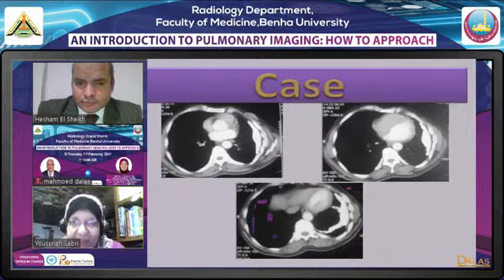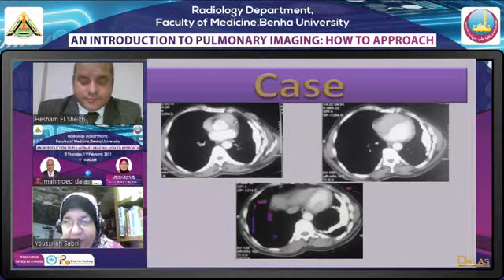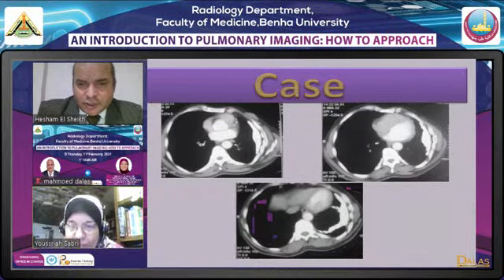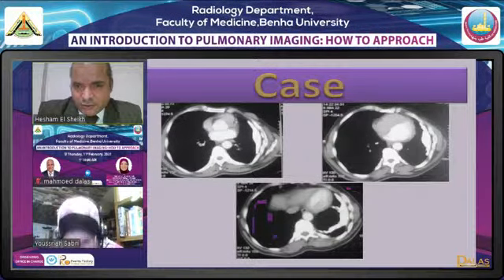Honeycombing: bilateral, fairly symmetrical, subpleural, predominantly basal, with clusters of cysts filling the pleural recess. Total different appearance. Okay, emphysema and lymphangioleiomyomatosis, I think, differentiation.